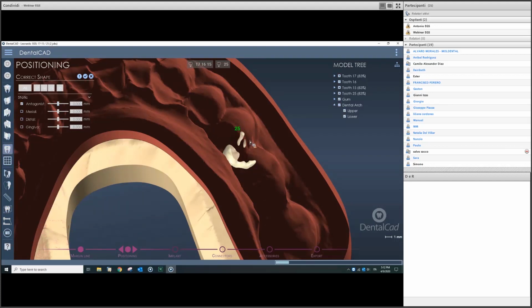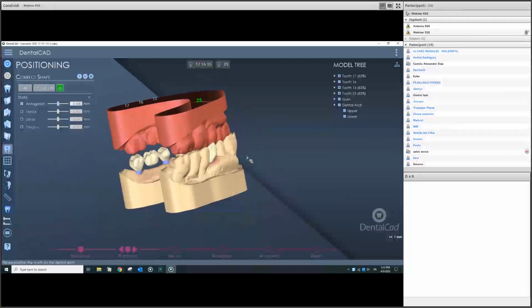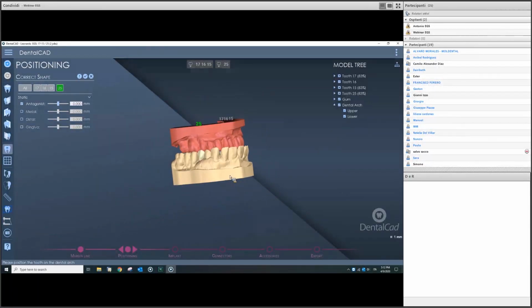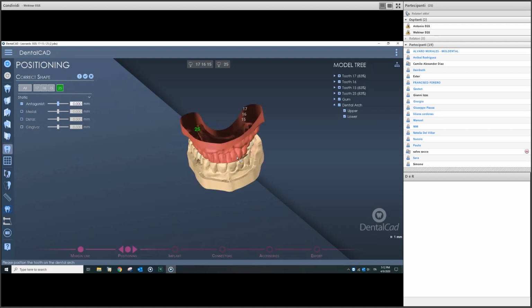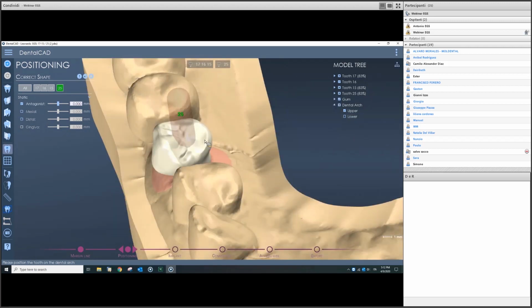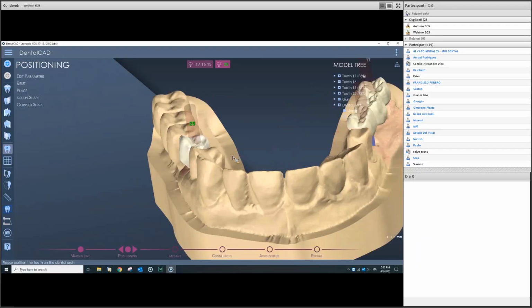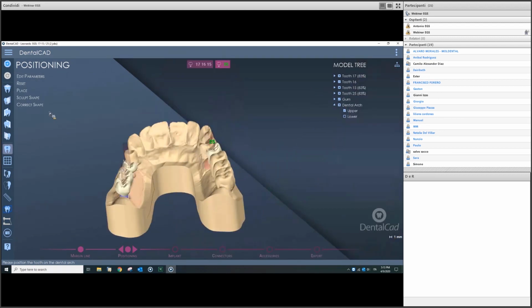In general, we have the digital articulator as well, but we are going to arrange another webinar on that topic. As you can see, the software has corrected the contact points. I can go back if I want. And sorry. Apply another time. Okay. Here we have the sculpt shape tools.